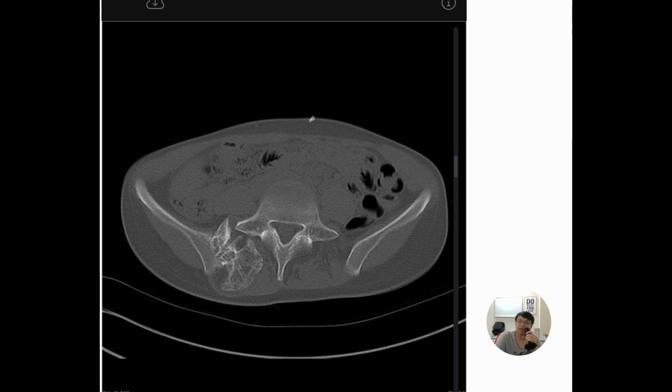And do be prepared that the orientation of the osteochondroma can be pretty challenging for you to work out what is happening, or can be very unexpected on the radiograph. And on pelvis radiographs, do compare both sides whenever you do not really see anything, especially in an examination setting.